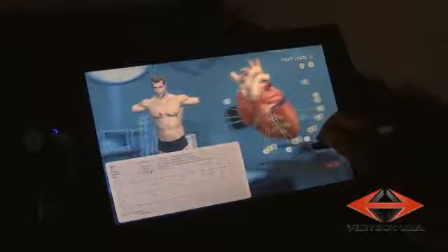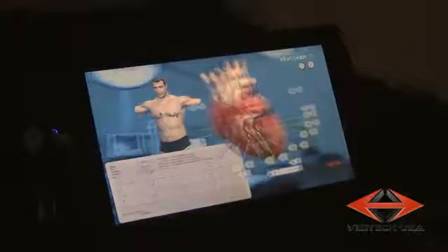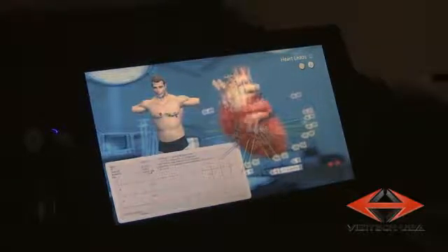Whenever we look at these readouts, we can see that V1 is portrayed there, and it highlights V1 vector going through the heart. Now, if we pull the front of the heart away, we can see that V1 electrode is going through the center of the heart, and it's measuring what's called the septum, or the septal wall. V2 is in a similar region. Look at AVR, AVF. Each one of them are highlighted to show you what region of the heart is being measured. Now you can bring this heart a little further out, and by leaning into the display itself, you're able to see a clipping plane that looks at the interior structure of the heart where each one of these exists.